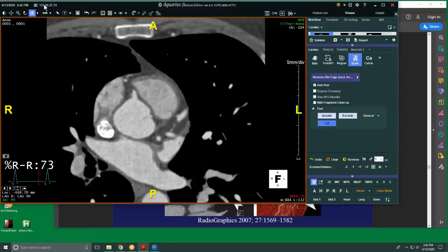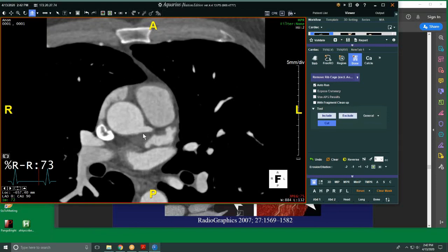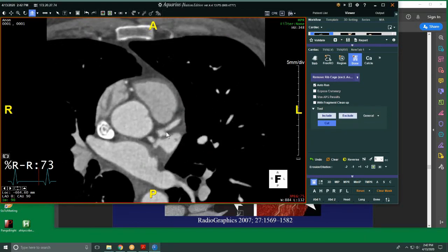Now the left coronary artery, okay, sorry, the left main is right here, okay? That supplies the circumflex artery and the LAD. And in this case, they've got a trifurcation where the three vessels split. It's almost like a trident appearance. And this third artery here is called the ramus intermedius. If it were a little bit more in either direction, you'd say it was a tributary of either vessel, but when it's a trifurcation, you call it ramus intermedius.